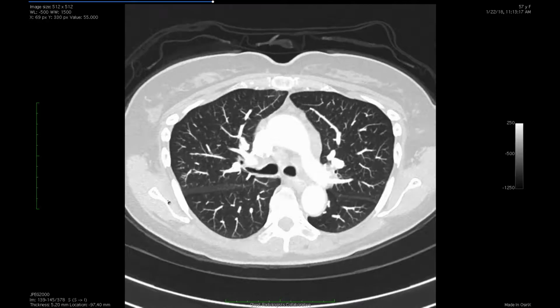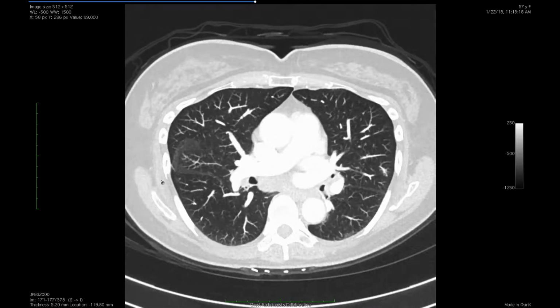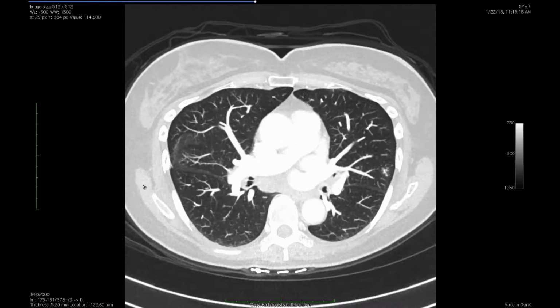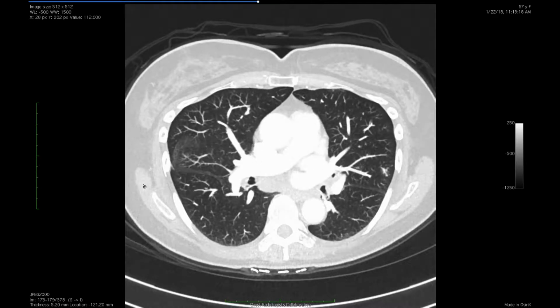And we've seen this before. We usually see it in the cases of renal cell cancer, I think. But look at that, this is a patient with colon cancer. And I know David has shown some dramatic examples of that too. I think we all have.